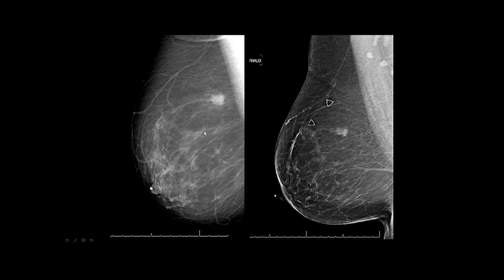I know technologists can be afraid at times when someone has a palpable and they're in a lot of pain, to give compression or for the patient to allow them to do good positioning, because they might be distraught, feel like they have cancer when they come in with a palpable. So they're not listening, they're not paying attention, the patient, and it's kind of hard to direct them to be able to do what you ask them to do. But it's very imperative. It's very, very imperative.